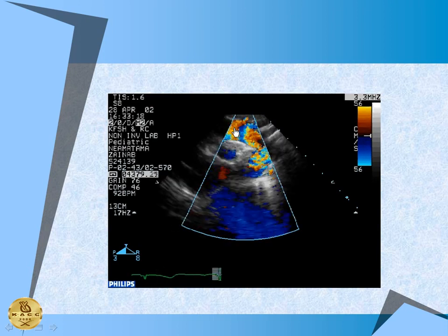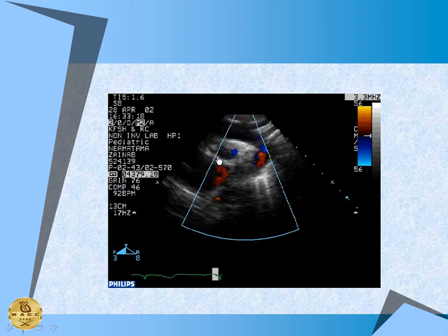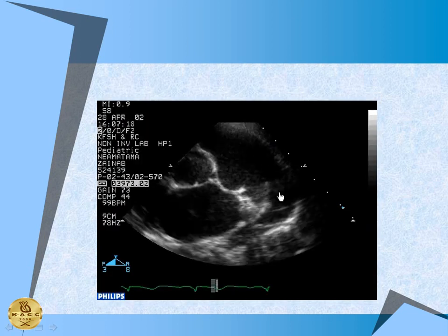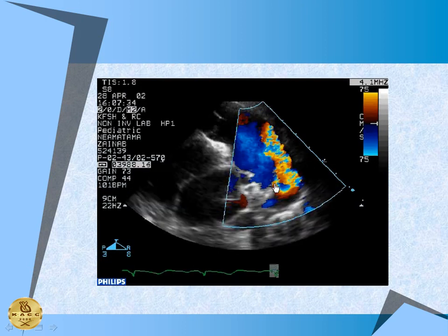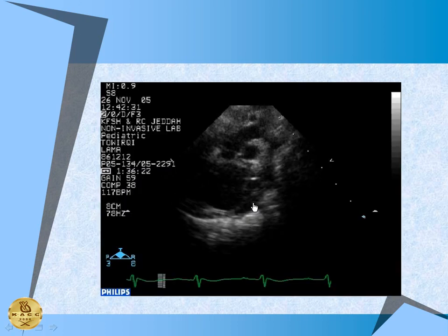You see, the turbulence starts in ascending aorta. This is somebody who could have a supra-AS or an AS or a sub-AS. And you have to be careful, and that's how we said multiple in-series obstruction can be difficult. This is a huge ductus, and this is most likely an interruption patient. And you see how the ductus can be, and this patient can go into severe heart failure. This is just the same long segment.